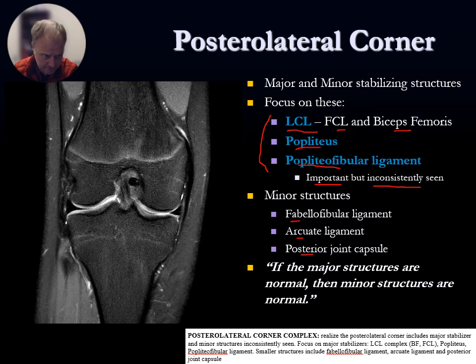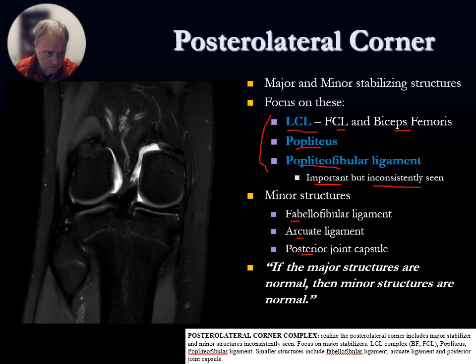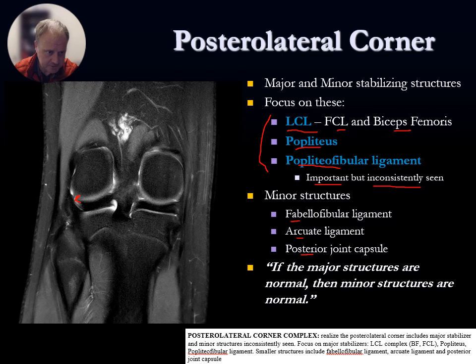So let's keep going here. We still haven't quite come into the LCL. What we're looking for with the popliteus is this diagonally shaped tendon which comes across the knee here, and you're going to notice it in this orientation as you come across the posterior aspect of the knee. It'd be very nice to be able to go back and forth to look at this better and see it all as you come to view, but you will see a muscle come here.